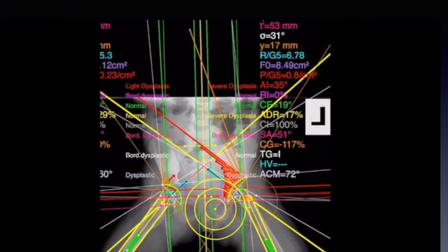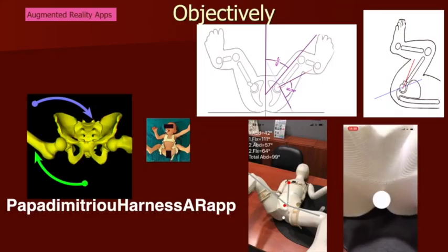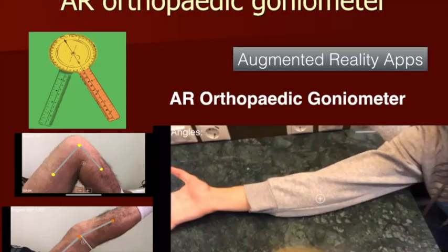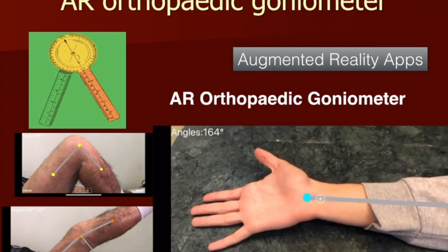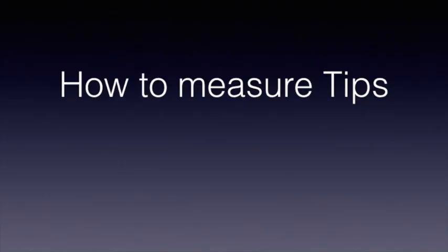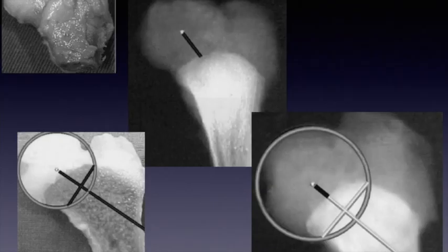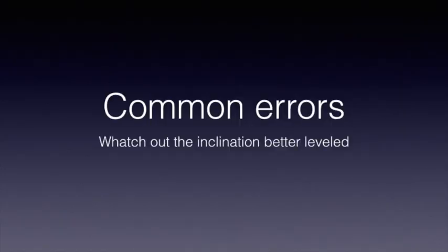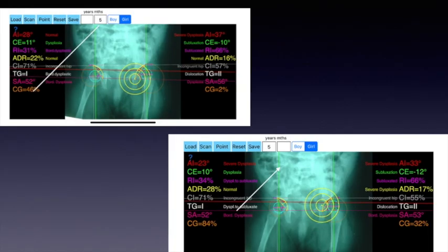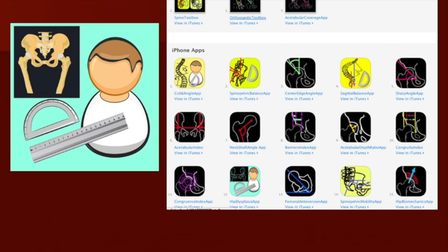In addition, the color of the pressure vectors adds very important information about the exerted pressure in the acetabulum. Red means not favorable pressure, green means favorable pressure, thus stimulating the growth. Green with black color inside means a very potent stimulus to growth. The changing colors of depicted pressure vectors and the changing magnitude of pressure vectors, which are depicted by the changing length of vectors arranged over the acetabulum, help and inform the surgeon both qualitatively and quantitatively in an instant. If the distributed forces are promoting the growth of the acetabulum, green vectors, it helps decide the optimal position of the leg in abduction by the splint.